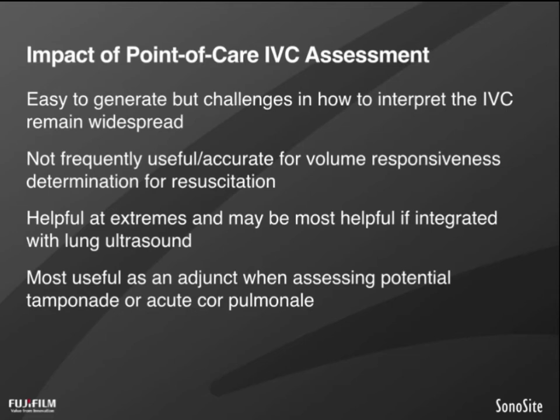You may consider using lung ultrasound in addition to IVC to help you understand who can safely be trialed with volume and who maybe you should hold off. If you're unfamiliar with A lines and B lines, please see those respective modules here at the Institute. Lastly, the IVC is most useful as an adjunct when considering the diagnoses of either tamponade or acute cor pulmonale, as we have reviewed.